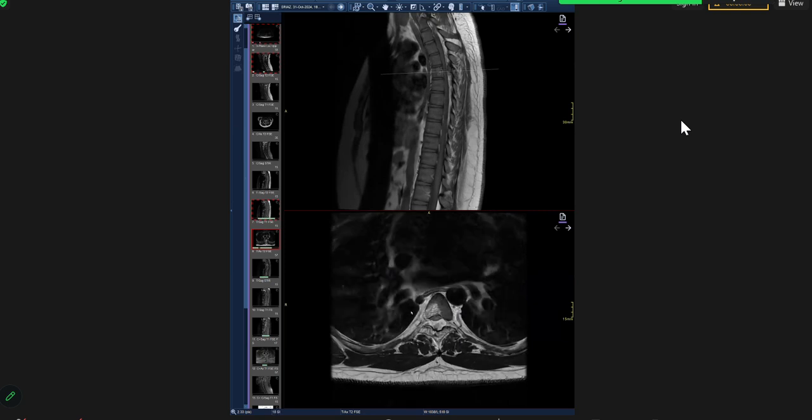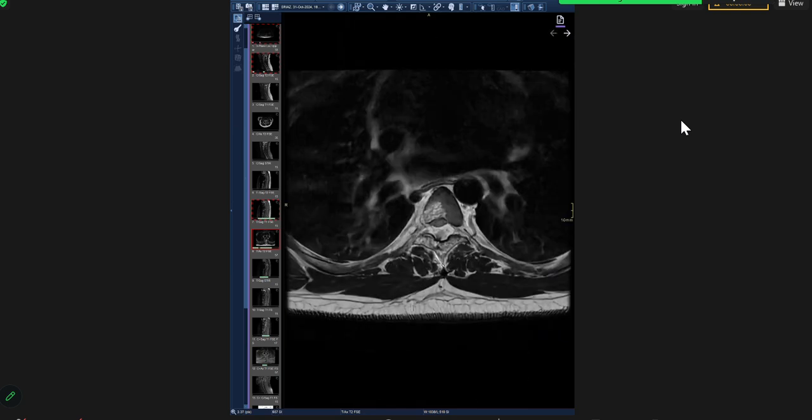I can't remember the name exactly, but this is a vertebral aggressive hemangioma. There are certain points in this which I'm going to go over quickly. It causes vertebral expansion, and then there is epidural extension, which we see in this case. There can be a compression fracture associated with it. There could be spinal cord and nerve root compression, because here you see the way it's extending in.